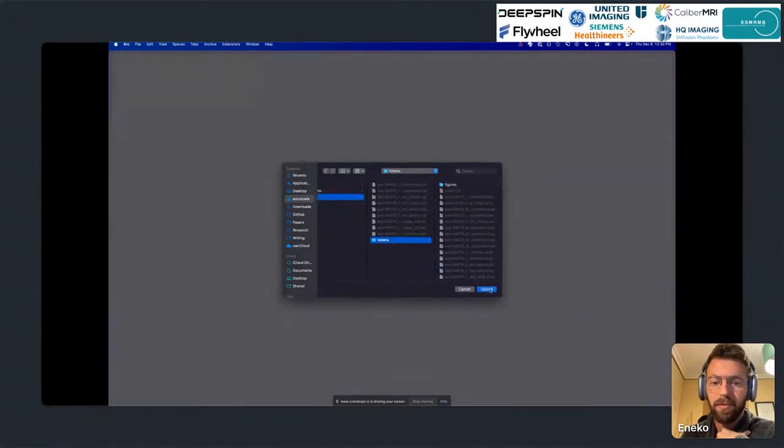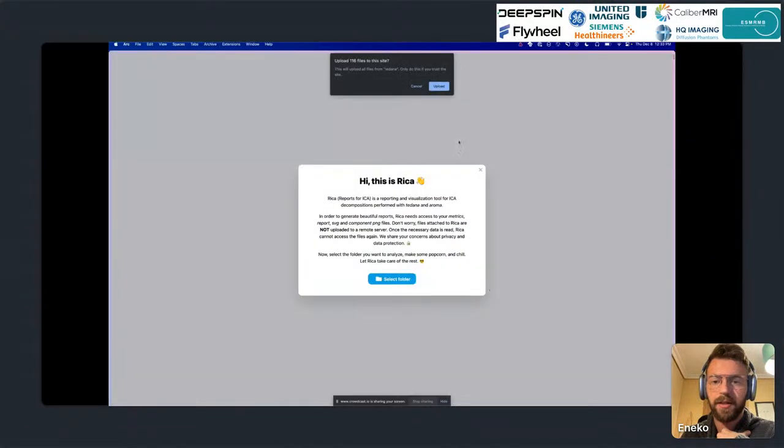And I choose to upload the entire TEDANA folder. It will ask me if I want to upload the files. I'm going to say yes. And it might take a few seconds to load. There you go.